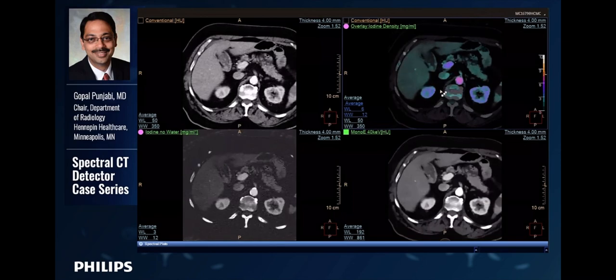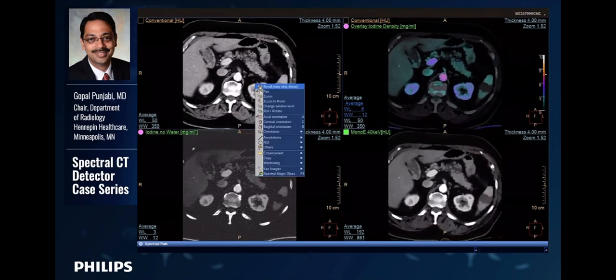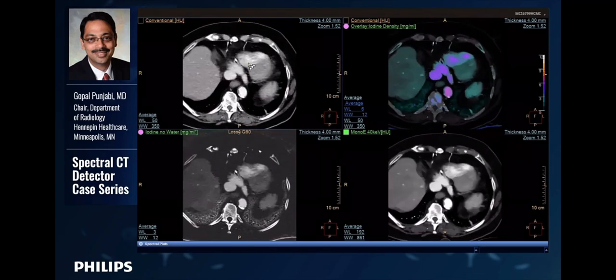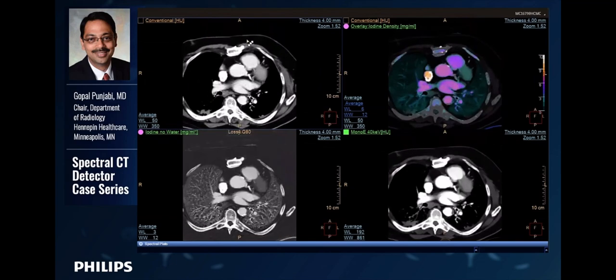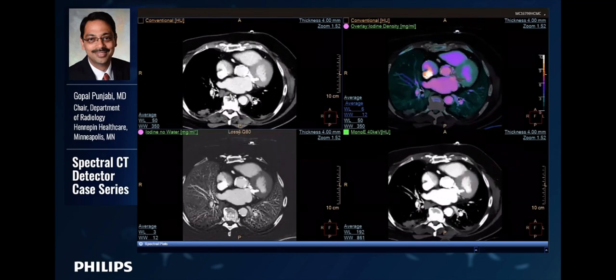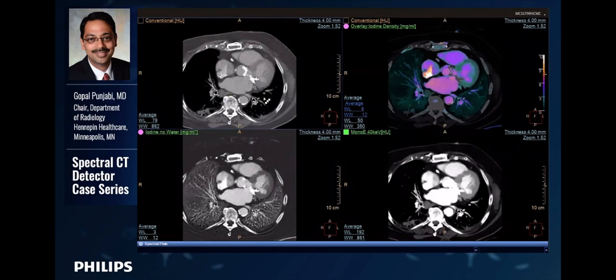But there is more. So patient with splenic infarcts and bowel ischemia, SMA clot, you worry about an embolic source. So as you come higher and you look at the heart, this patient has had a previous sternotomy and has an aortic valve replacement, also has had a CABG, and you can see the prosthetic aortic valve nicely here.